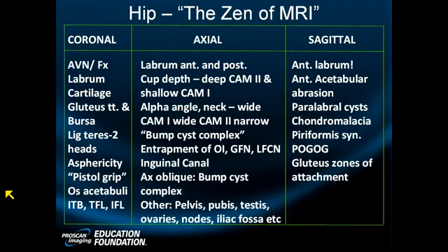This one showing very nicely the hyaline cartilage and this little bony roof step-off right here. Not a defect. That is where the triradiate segments fuse. That's normal. Ligamentum teres, normal. We had some thinner slices. We could see the two heads.